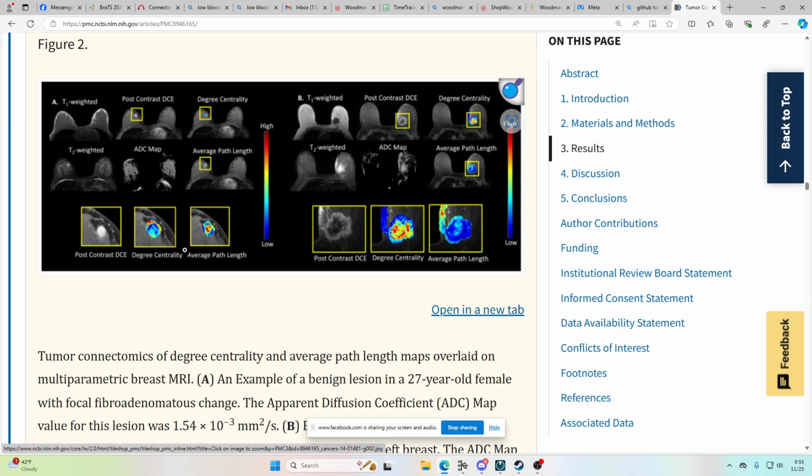Glioma is a heterogeneous tumor. The cancers differentiate into different types of cancer cells, and differ in how they invade and infiltrate the surrounding tissue. We're trying to understand the cell type distribution in the tumor by comparing the cell types in each 3D region of the tumor.